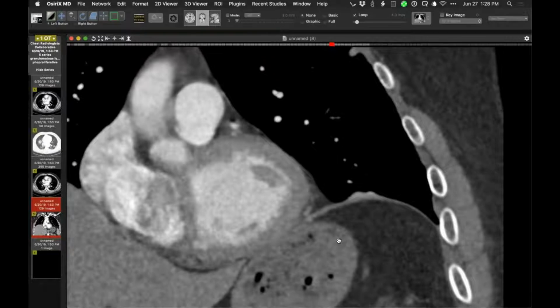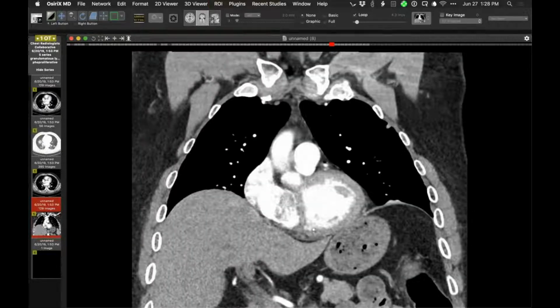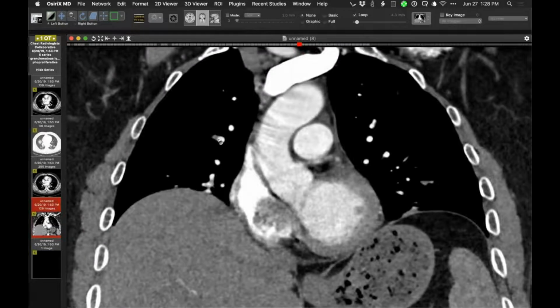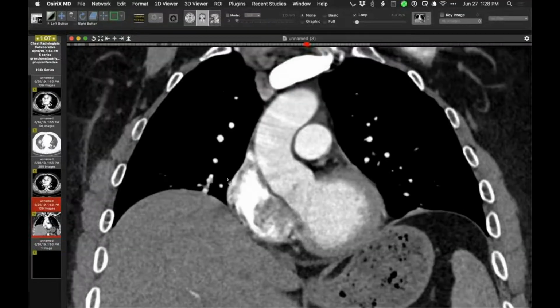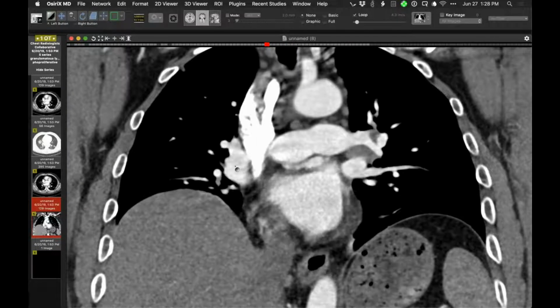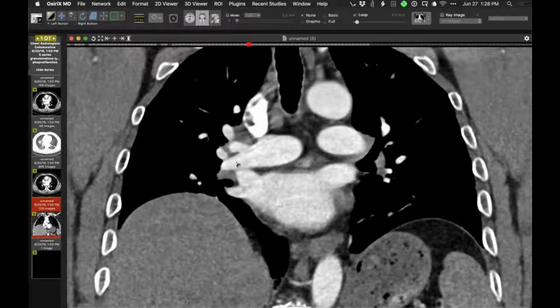I don't think I've ever seen it so far peripheral, but maybe I need to start looking. Yeah, this is not common. I've seen it on occasion. Like here's one here. See that there? And there are a couple places.